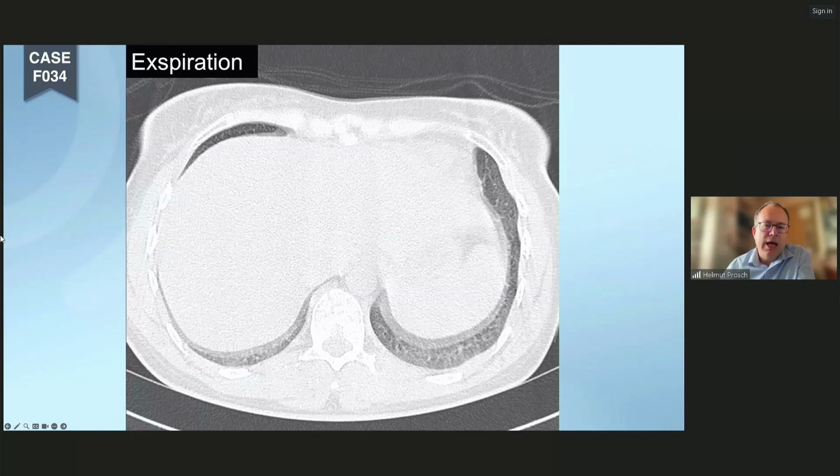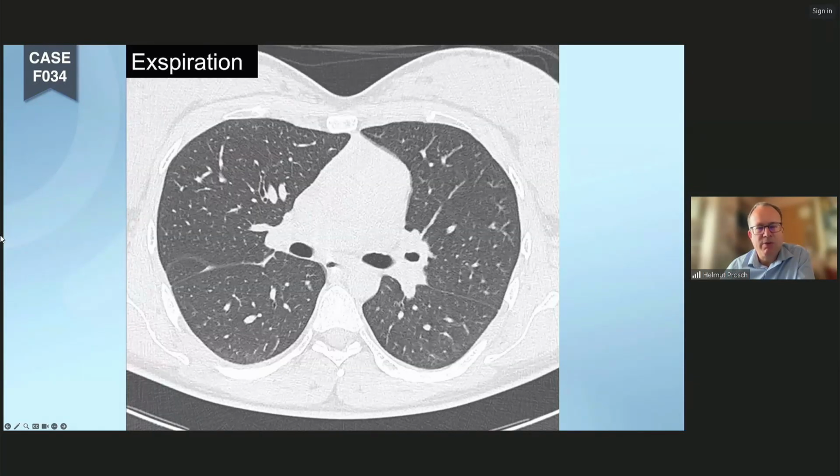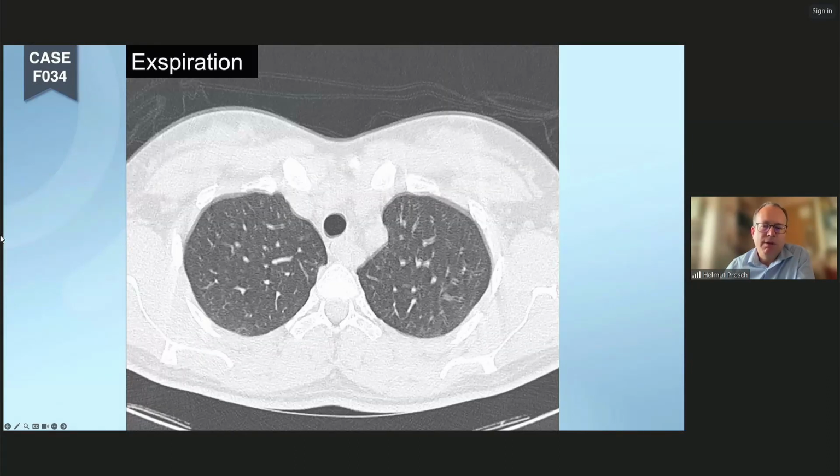The patient did not understand the technician. She did not understand German and not any of the programmed languages in our scanner. And this was the expiratory scan we performed. And you see here, when we wanted to perform an expiratory scan, the patient did take a deep breath. So this is a common pitfall, and this is a very important pitfall when it comes to follow-up examinations.